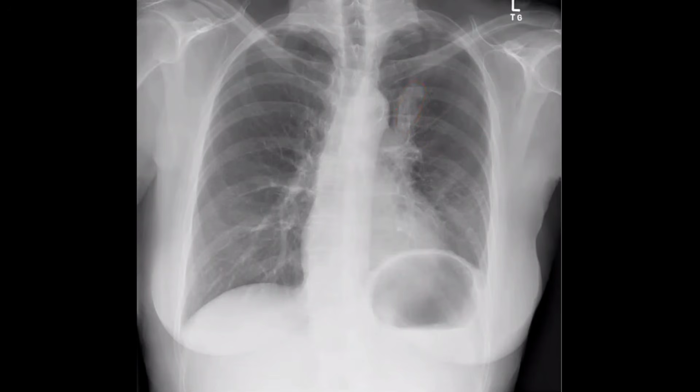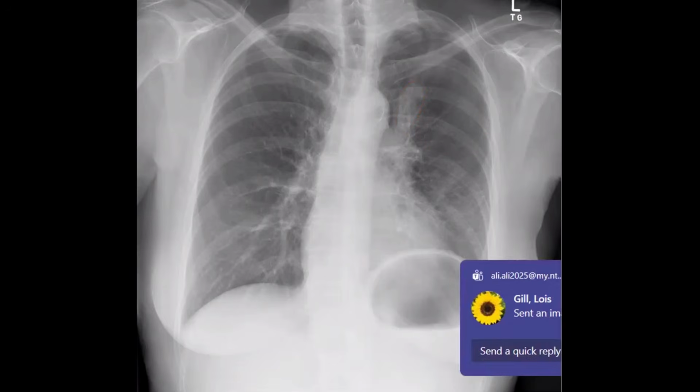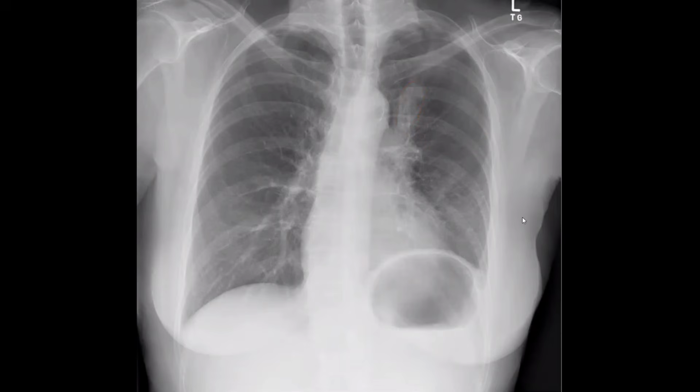You told me that we have another opacity silhouetting the cardiac border. I need more precise words. Yes. There is an elevation of the left hemidiaphragm more than the right one. Okay, perfect. Yeah, you are right. Is it considered as a benign feature or malignant feature? Diaphragmatic elevation. Here we consider it as benign because I see all the diaphragm, but it is elevated somewhat.